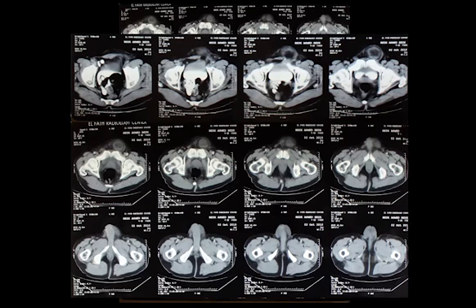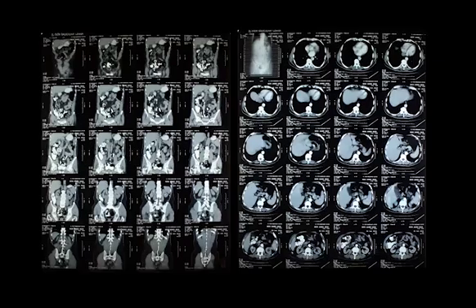Okay, let's continue. How do you want to investigate it? Sorry, go on. We were talking about the urine and the contrast. Let's see here where the urine is and where the contrast is.